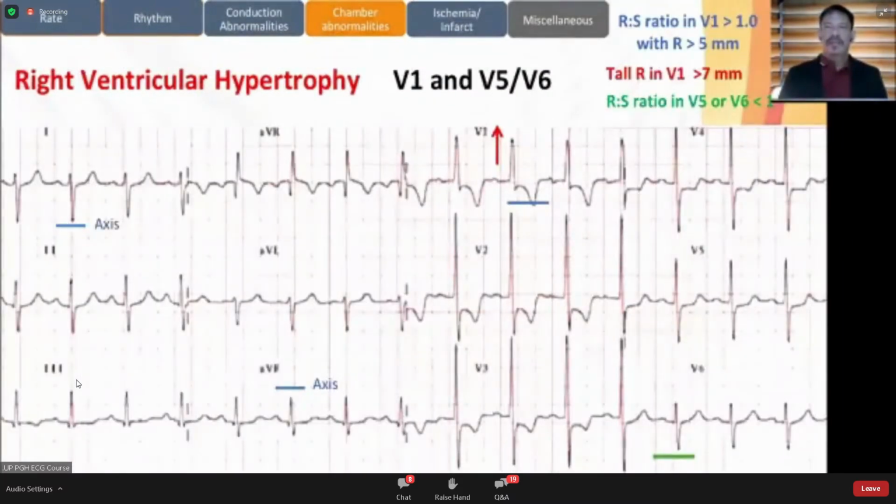For right ventricular hypertrophy, the chest leads nearer the right side show which V1 exhibits taller R amplitude, with V5 and V6 having deep S. There is also right axis deviation manifested as upright aVF and negative lead 1.